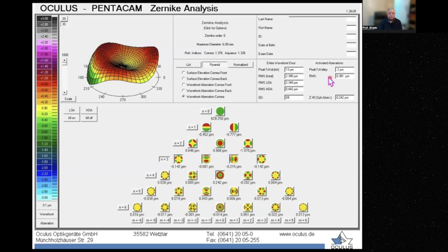In this eye, not necessarily to be both eyes together. So in this eye, you can implant this or that or this, and you can make another decision maybe in the other eye if it has different RMS. Okay, and this can explain as well the symptoms of the patient, so if you are planning for LASIK, laser, SMILE, whatever, you can decide whether the patient needs customized laser vision correction or not to address the coma, for example, or the spherical aberration.